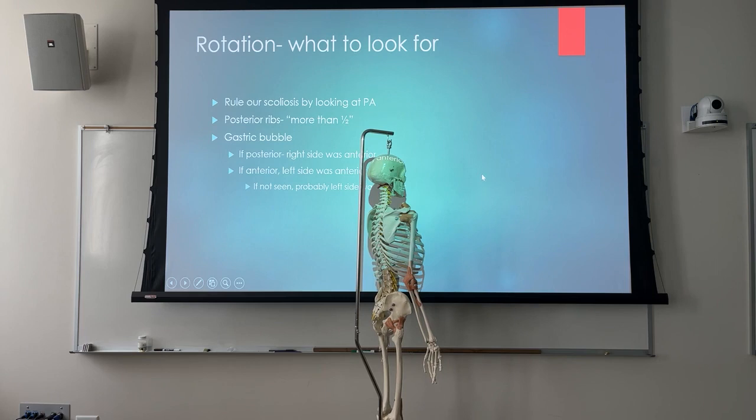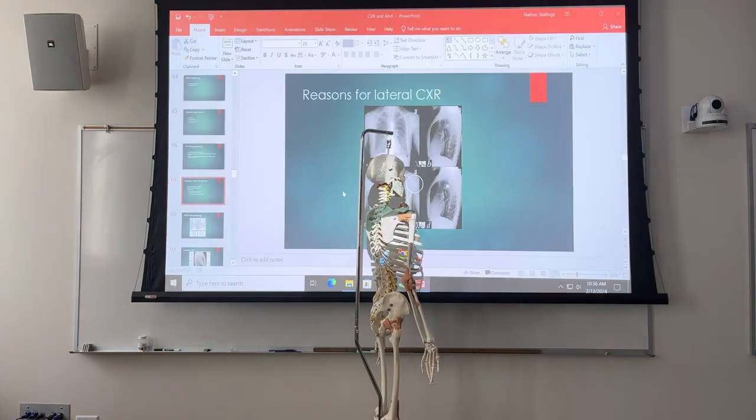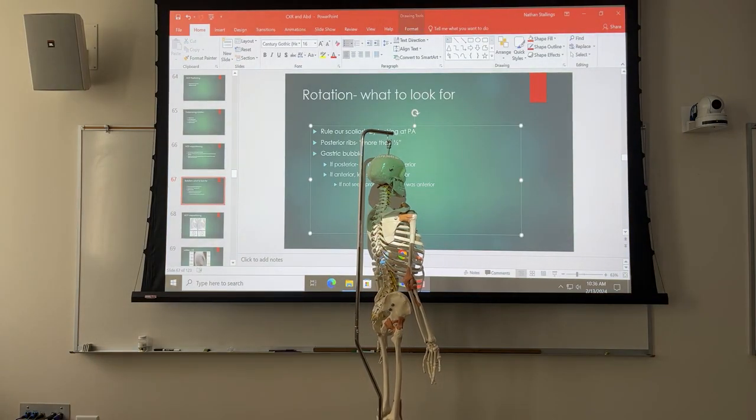And that gastric bubble is posterior. Okay, so I'm telling you, this is work in progress. Left side was up, that should say right side.